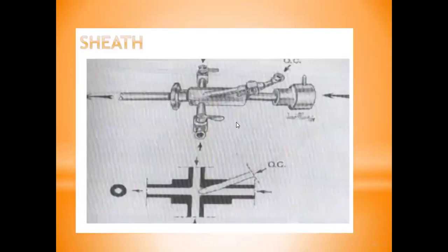This is also the operative sheath. We look at the large diameter, and this is the area to enter the fluid, and this is the area for an instrument to be entered through it.